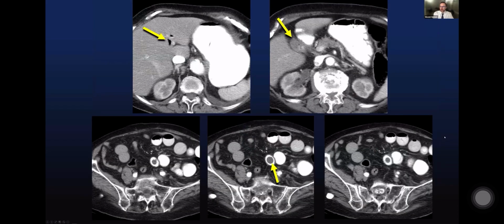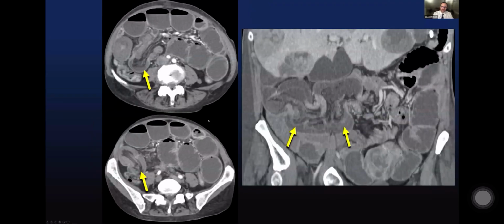Another case where the bowel contents are the clue to this classic diagnosis of a patient with pneumobilia, a contracted gallbladder, and a small bowel obstruction with a rounded calcified object at the transition point. This, of course, is the so-called gallstone ileus from a biliary enteric fistula, classically between the gallbladder and the duodenal bulb. Small bowel contents, again, they include the obstruction here. Hopefully not too much of a diagnostic dilemma.